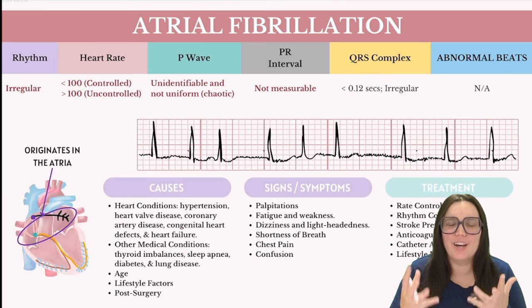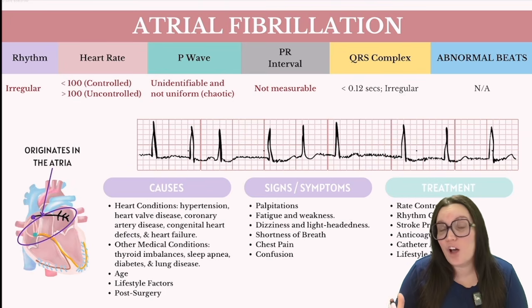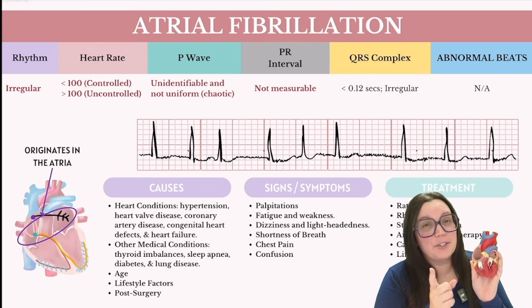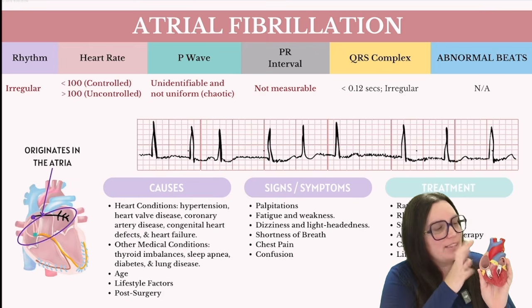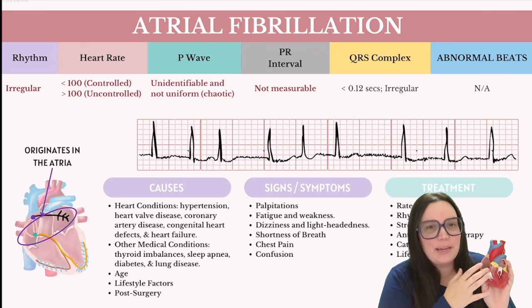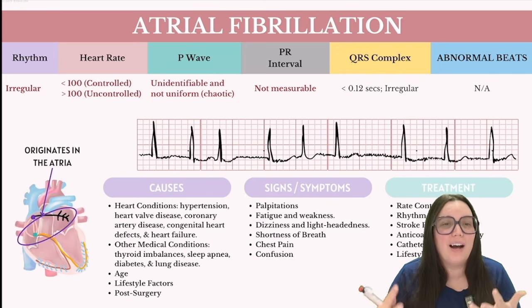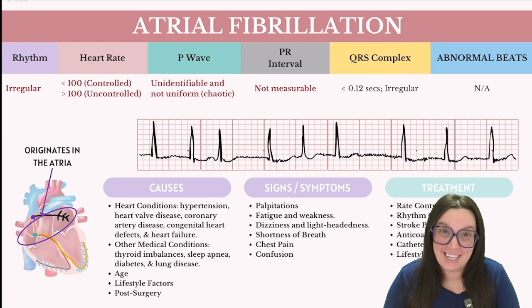So let's begin with our most commonly seen atrial rhythm known as atrial fibrillation. It's also often referred to as atrial arrhythmia, and it is a prevalent condition among many patients, especially the elderly cardiac patients that you may see. So this rhythm is characterized by our atria, these are the upper chambers of our heart. And what's happening up here is we're having this quivering or fibrillating rather than actually having a full normal depolarization. This quivering is going to lead to high rates of atrial activity, close to almost 800 times per minute, a rate that would be unsustainable for the ventricles to match.